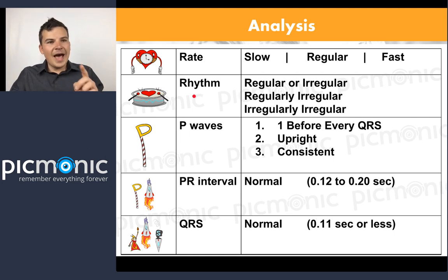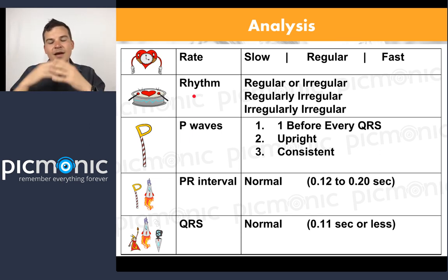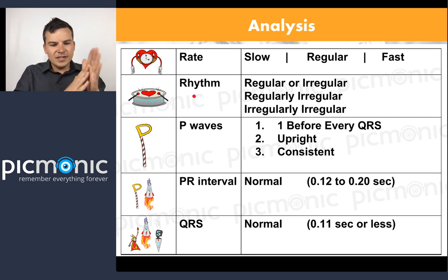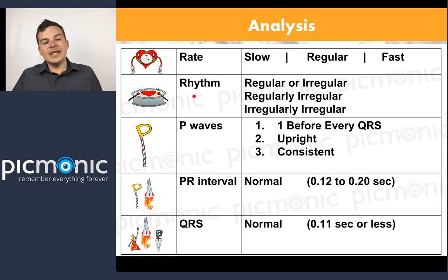And then we're going to look at the QRS complex itself. Basically the last one is, is it wide or is it short? Is it greater than 0.1? I like to say 3 boxes, just for simplicity's sake. And you see some variation in the text on 0.1 seconds. Woo! There's a little Freudian slip for you. And then 0.12 seconds. But I always just in my mind think 3 boxes, because I know 3 tiny boxes are 0.04 seconds apiece, times 3, 0.12. Mainly because I'm a math nerd.